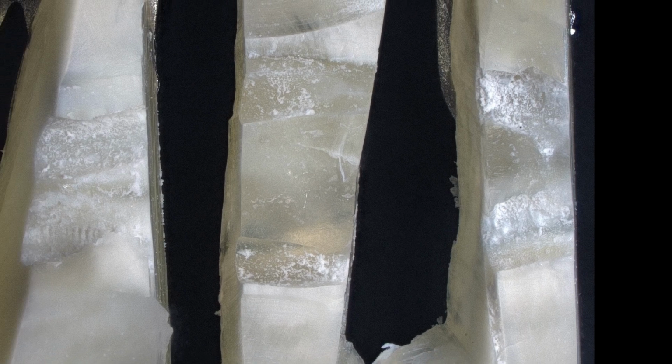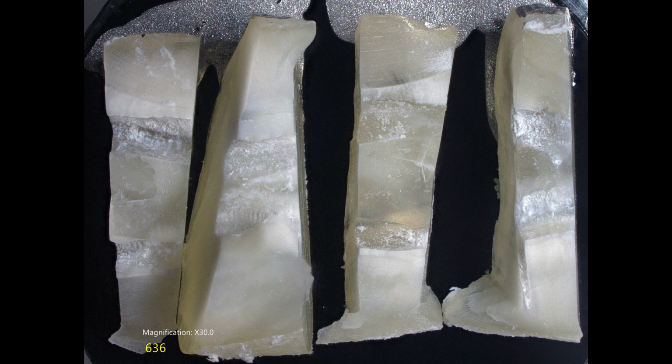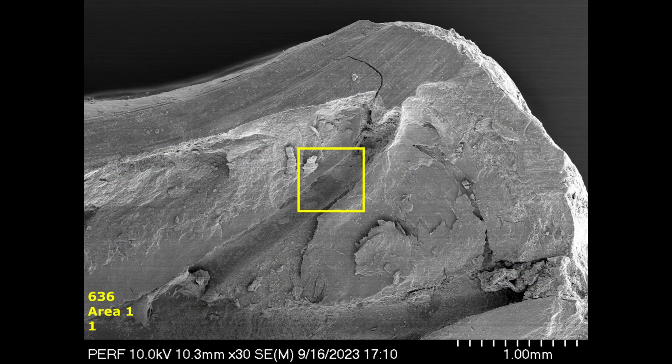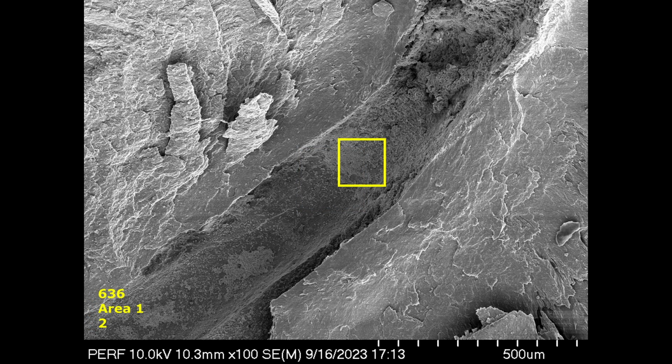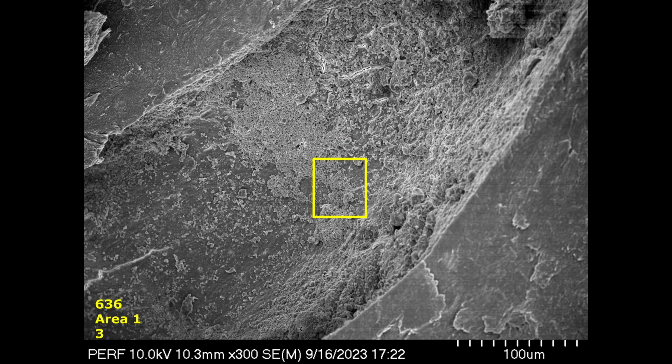I was able to get quite a few sections and examine about 8 different areas, or at least document 8 different areas. I looked at all of these very extensively, and none of them were very different. I tried to brush away as much of the calcium hydroxide as I could, and then labeled the areas so that you'd know what you were looking at. In the sagittal section, we went up into an area of kind of a bifidity and got a chance to look at the naked dentinal wall fairly well.